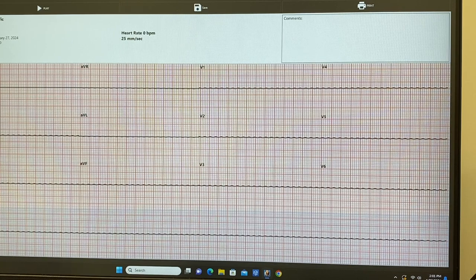I see a quivering. Yeah, quivering. Okay, what do you not see that worries you? There's no QRS. Aha, there's no narrow looking QRS, right? Okay, so what is it? So it's ventricular flutter. No, ventricular fibrillation. How is this different from the other one? This is a fine VFib, because the amplitude of the electricity is lesser.